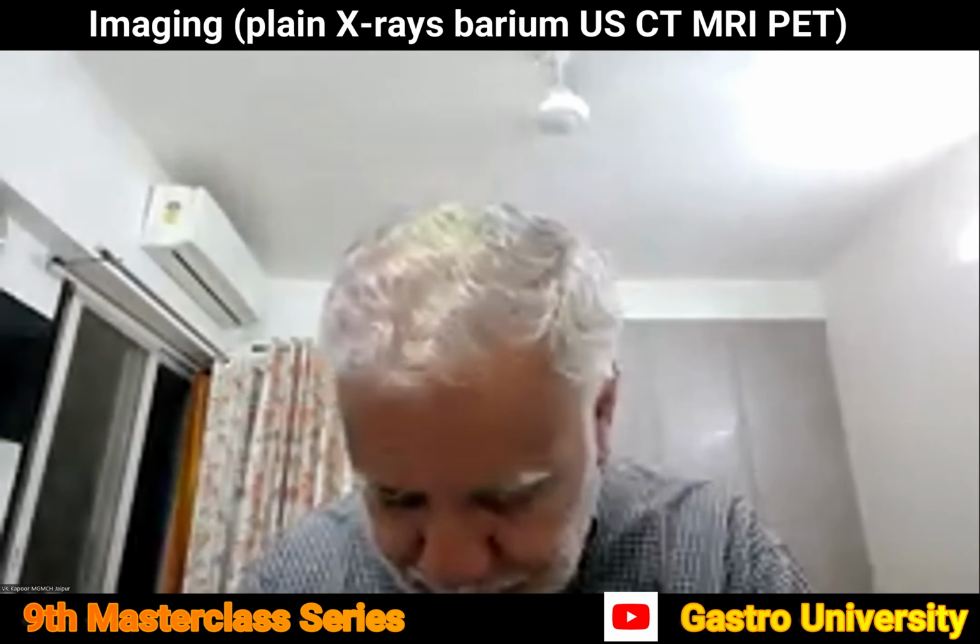Yes, sir, we are performing barium swallows even today. But as far as the small bowel barium studies are concerned, we have totally stopped doing that. And it's just the post-op scenario where we are doing some barium or contrast studies. The reason is quite clear: we get much more information with CT than what we get with barium.